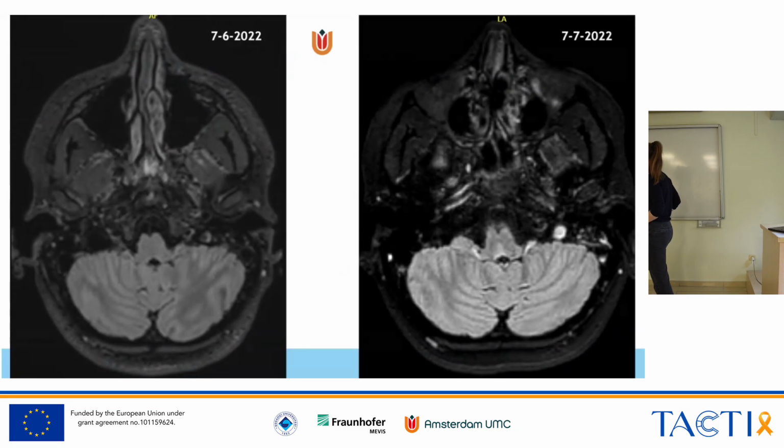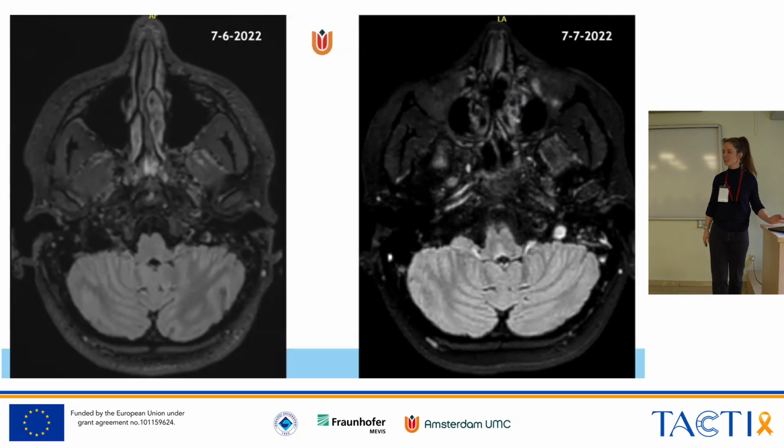And the question is, do you see any differences between the two? Yeah, where do you see the differences? On the left side, patients. Yeah, this one? Hyperintense area, yeah, here? Yeah, you're right. It's easy to overlook that area. What is the area, Vera? This is the obex area of the fourth ventricle. So we're at the lowest part of the brainstem and just above the start of the spinal cord.